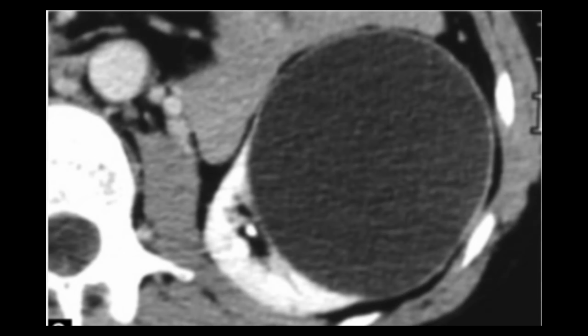This is a close-up view of the CT image, and here you can see that it has almost, I would not say obliterated, but it is occupying the majority of the cortical part of the left kidney. This happens to be a simple cyst, and there are no internal contents in it, because this was a contrast enhanced CT, and this falls in Bosniak category 1.